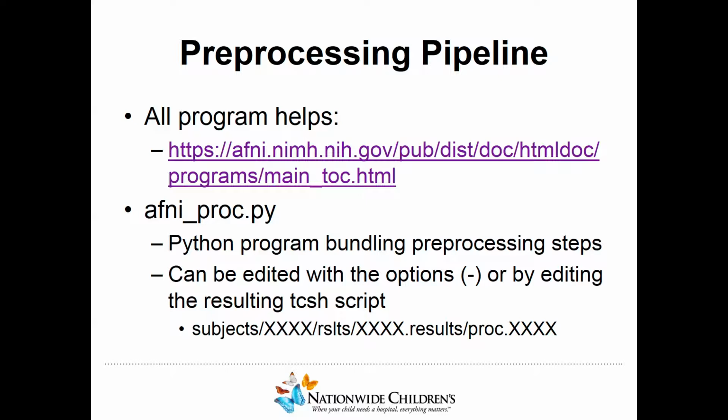It's really a wrapper program that generates a script in T shell, which is the C shell in Linux that's also commonly used. Basically it's a program to generate these T shell scripts that will actually run your data for a single subject.